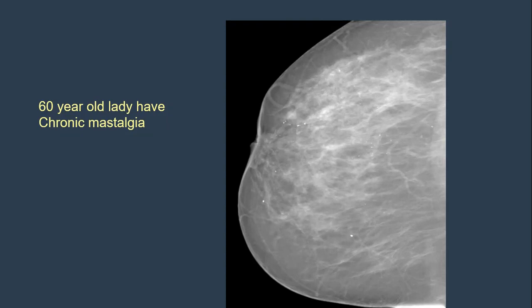The most common, especially for the elderly. Any volunteer? And this is ductal calcifications. This is not very clear, but it is ductal calcification.